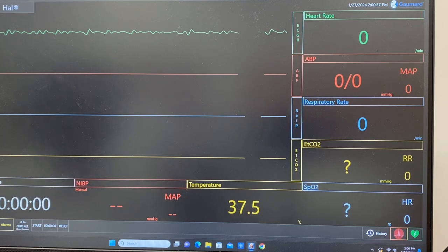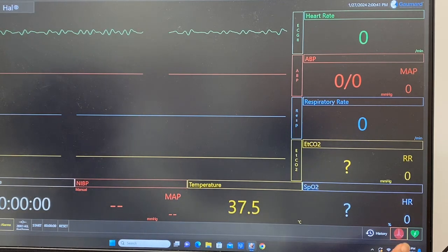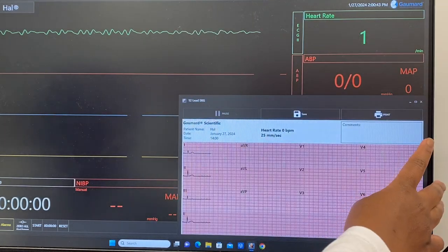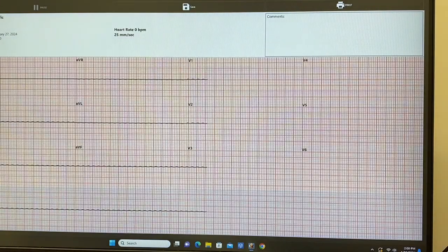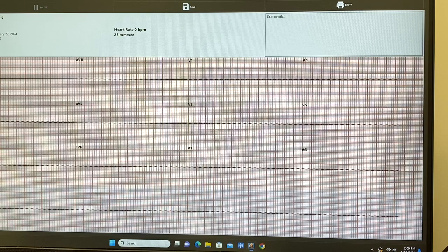Now look at your 12 lead and see if this shows us a good rhythm. Yeah, it's good. So that first one doesn't count. I think that first one just shows up to tell you what would have been normal height. That's what that is for. Okay, what do we see there?